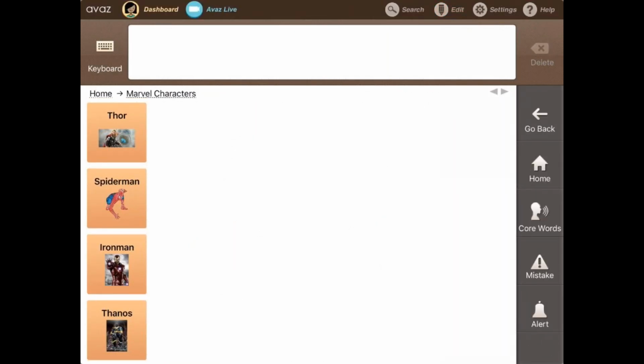Now if I click on Thanos, it speaks out the word wrongly. The actual pronunciation is Thanos, not Thanos. But the reason it is doing that is because Thanos is not really a very common name, which is why the synthesized voice that we have does not know how to pronounce it.